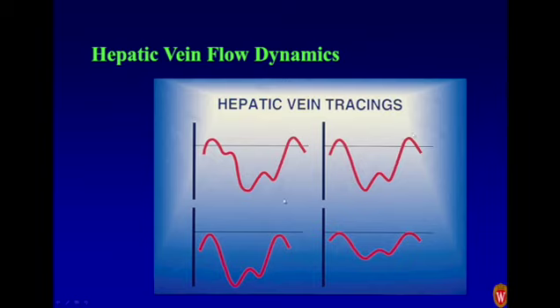You get a little further away from the heart, and that may not manifest as actual reversal, only as a slowing of flow. Get further away, it starts to get damped out. Now, how far from the heart you see this waveform is totally a function of how well hydrated the patient is. If the patient is dry, then there's not much blood in the inferior vena cava. And therefore, if the vessel walls coapt, if they kiss, then that wave stops. It's not going to go any farther.